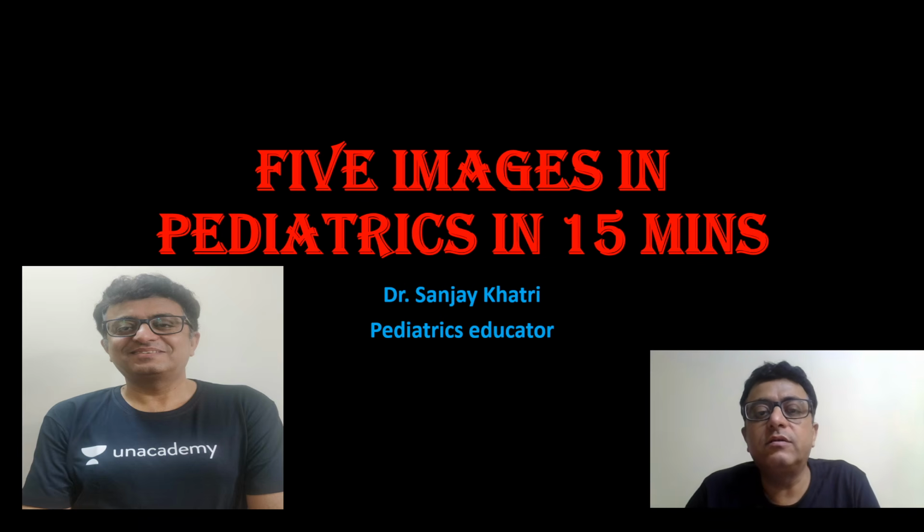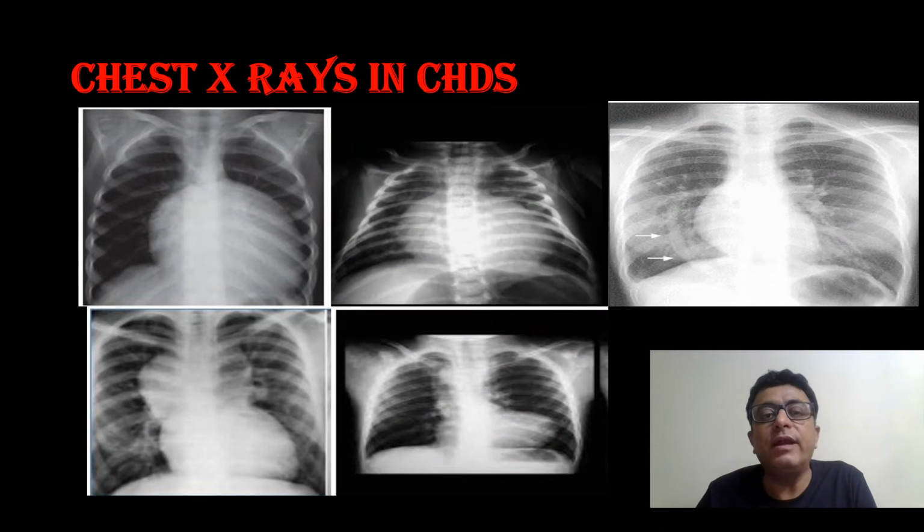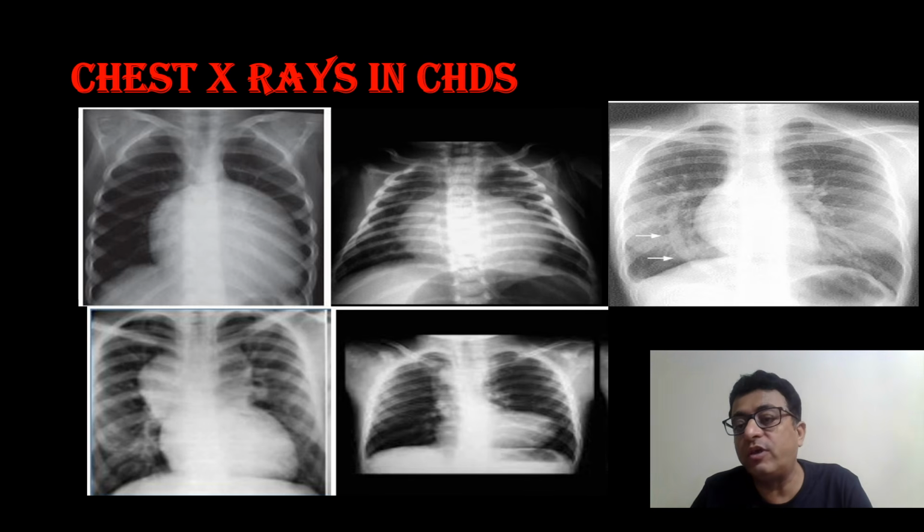In today's session, we will discuss 5 images in pediatrics in 15 minutes. Today's concept is that we discuss chest X-rays in CHDs. You will find many X-rays with some typical appearance. So we will try to identify these X-rays, see what MCQs come from them, and what the peculiar features of each X-ray are.